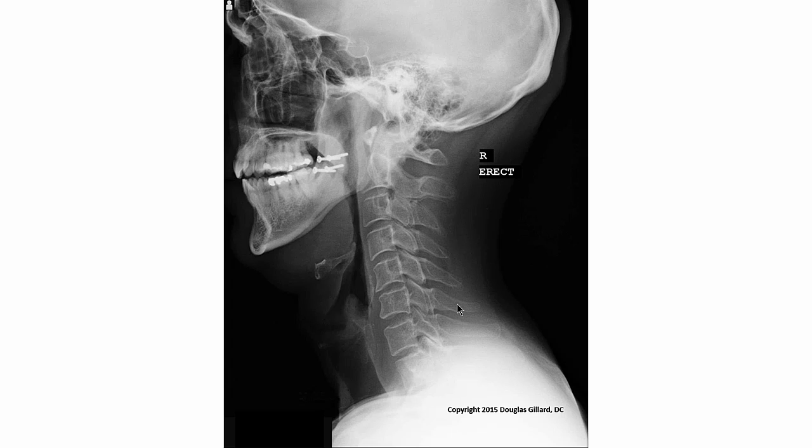Do I need to say anything else? Mastoid, I want to show you the mastoid. Well, look at all these soap bubbles. Mastoid air cells, and here is the mastoid process coming around. Got it? Here's another one. What's this bump? Good. External occipital protuberance. Next.